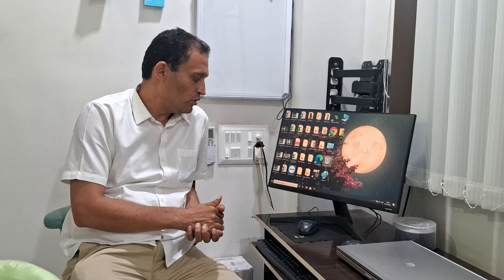Good morning, friends. Today I am going to talk about cone beam computed tomography software, or CBCT software. This is software of an Italian company which I am showing to you, which is the machine I am using. The basic principles for all the software are the same, and for interpretation of the maxillofacial area, the basics are the same. Now I will start the software.